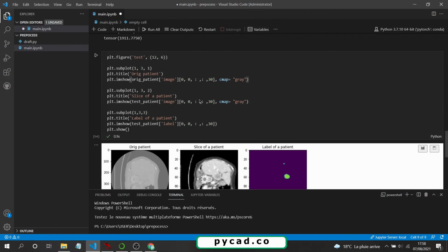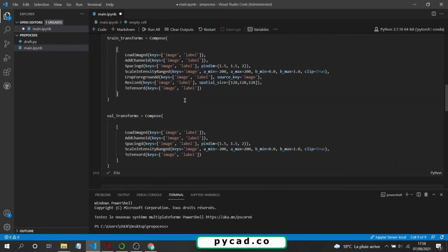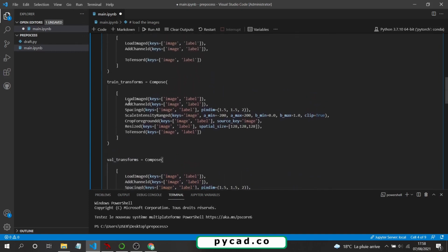So we are now at the end of the video. I hope that it was helpful, and sorry about all the mistakes that I made. But as I told you, if I am doing a long video, I always make some of these mistakes. And to summarize what we did, the summary of our work is always: load the image, add a channel, and convert at the end the final result into a tensor.